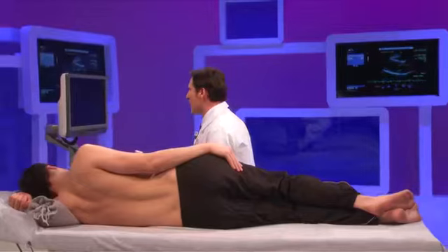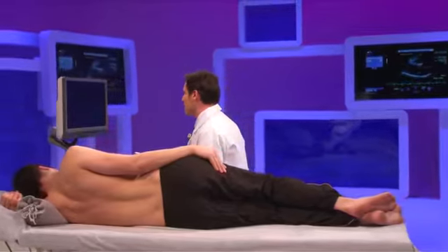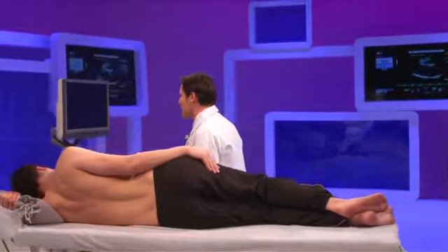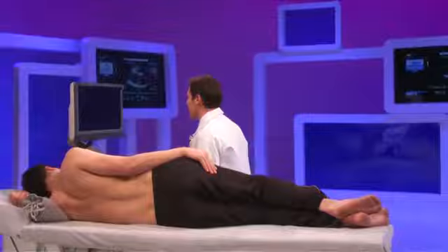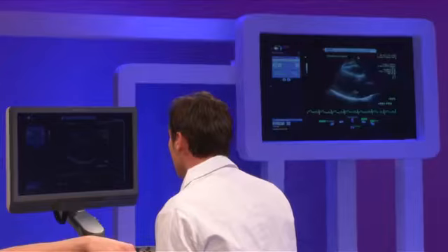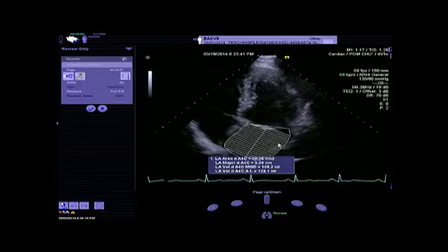So now let me move to the last part of this presentation regarding the consequences of the mitral regurgitation on the left atrium. And here we can have the measurement of the left atrium volume using again the Simpson method. We have a volume more than 128 milliliter, and we should index this value for sure in these patients.